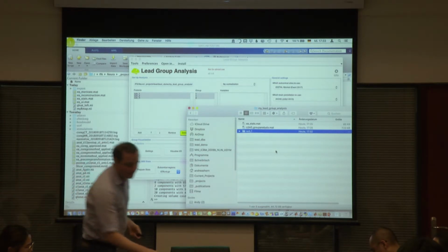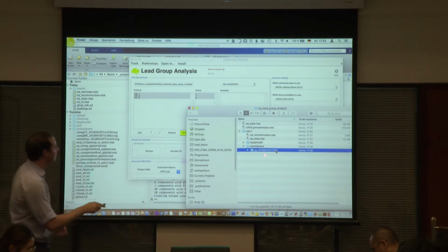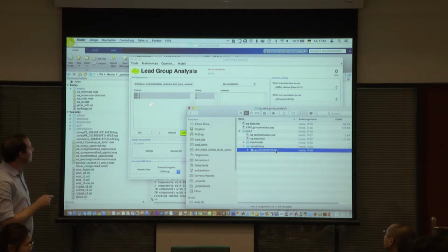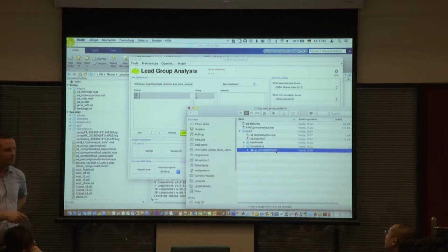In this case, it's this 2018-09 ID, and that's how each analysis will always know, okay, this is my simulation. And it will also not bother with the individual simulations that you make. So that's sometimes crucial to know if you want to script things yourself, but these belong to that group file.